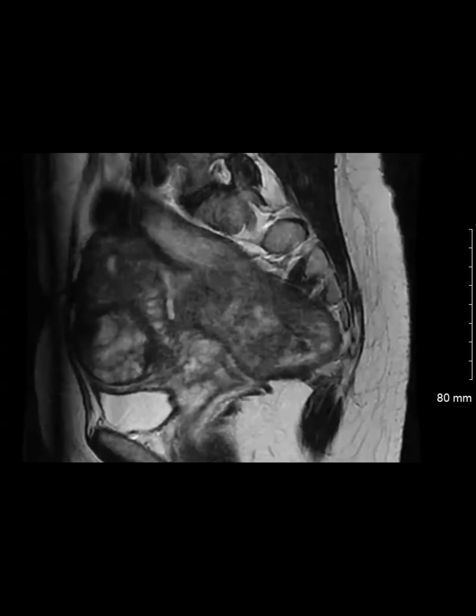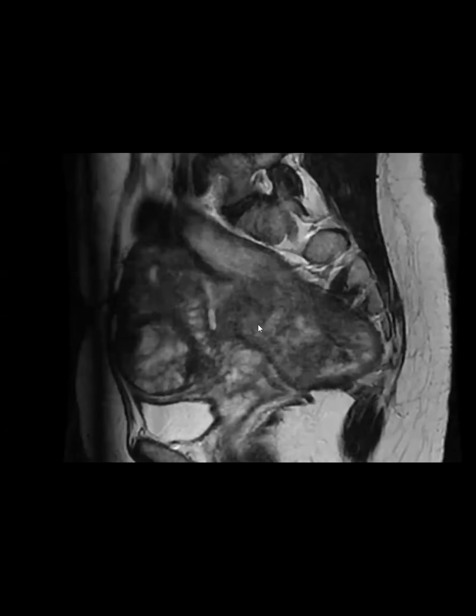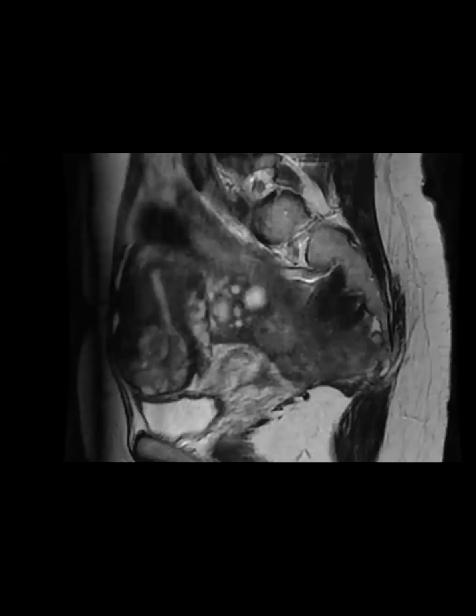Nice. But when you say intrauterine, it doesn't look like a normal gestational sac. No, they did identify that the gestational sac was abnormal. That's why they went in for a curettage in the first place. Got it. Yeah, they did identify that the pregnancy was not progressing normally, and they had also presented with bleeding.